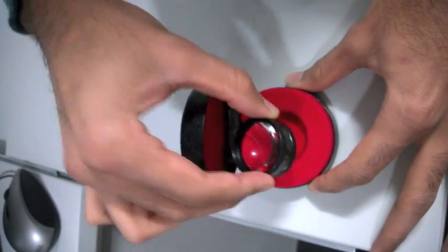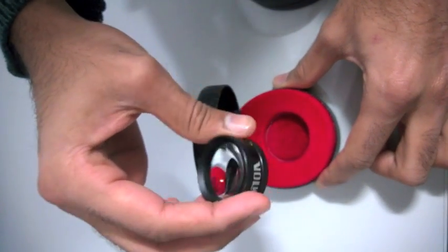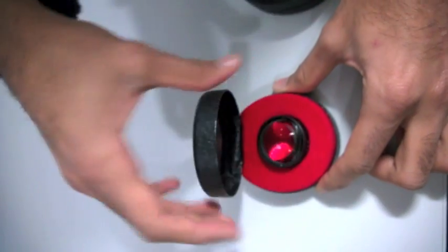There are 60, 78 and 90 diopter Volk lenses available. The higher the dioptric value of the lens, the lower the mag and the working distance, but the larger the field of view.